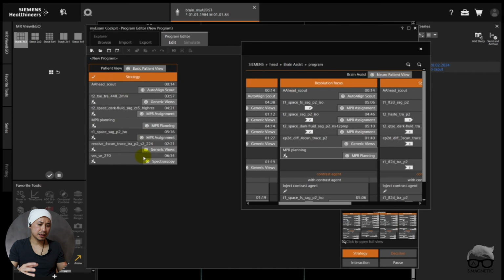So like I said, it's more like set and forget. By that I mean, if you are happy with this one, you can copy this to every other protocol. So just the first time you have to do it correctly, and then it should work. Well, that's it, guys. I hope you find this video valuable. I know many of you guys have written comments, oh, why does the sequence just automatically open? But now you have the answer to overcome that issue.